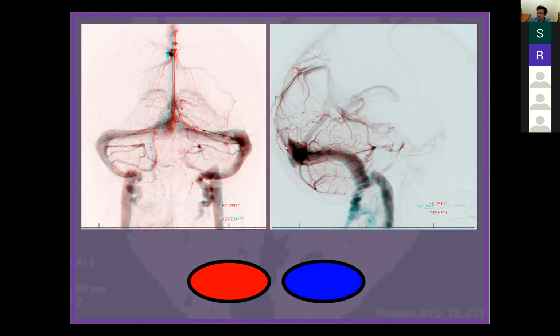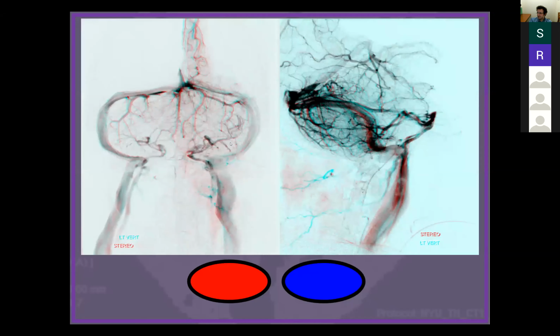You know, straight sinus. This is another one. So here, guess what? You've got another dural channel right here. These veins are medial parieto-occipital veins draining into a dural venous channel in the falx that's connecting to the Galen right there. You see that? Another person, again, repetition, this is how you learn.